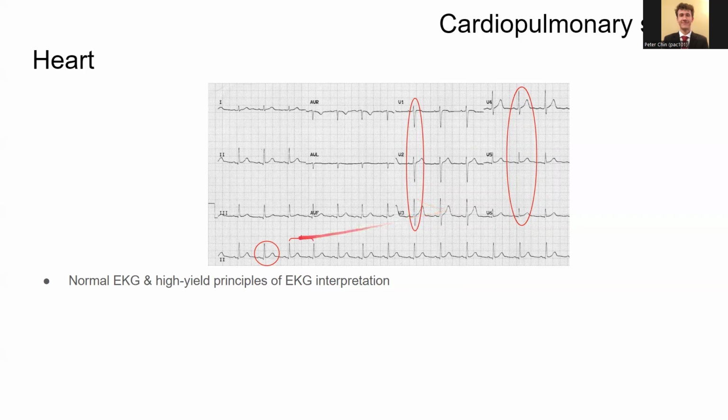When I'm looking at an EKG, the first thing I look at is the rhythm strip, because that gives me the best holistic view of what the heart is doing from an electrical standpoint. After looking generally at the rhythm strip, I look at V1 through V6. Sometimes I'll look at the QRS complexes in particular to see if there's appropriate axis progression, which basically means you want to see a largely negative QRS in V1 that progresses from negative to more positive until it's positive in V6.